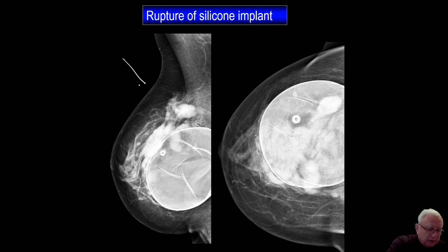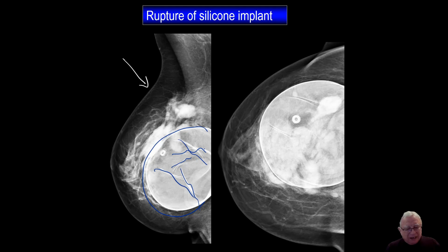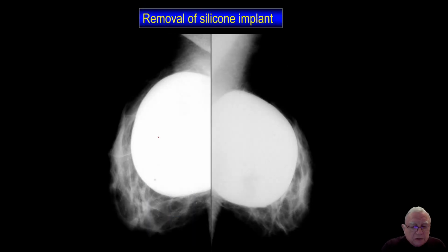She reported that her old silicone bag started to behave strangely, of course. And if you do ultrasound, then you have this phenomenon we call the linguini sign. And this is silicone. Eventually, Mother Nature is going to localize it, and then it's going to calcify later on. Old silicone bags should not be around. Plastic surgeons recommend that every 10th year you should remove it.